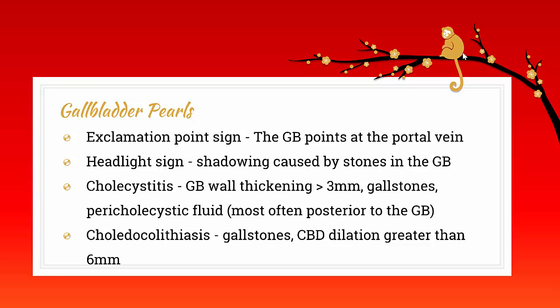Next, you must recognize the headlight sign or shadowing created by gallstones if they're present. If you're provided with a clinical picture suggesting cholecystitis and an ultrasound image with gallbladder wall thickened greater than 3 millimeters, gallstones, pericholecystic fluid, then cholecystitis is confirmed.